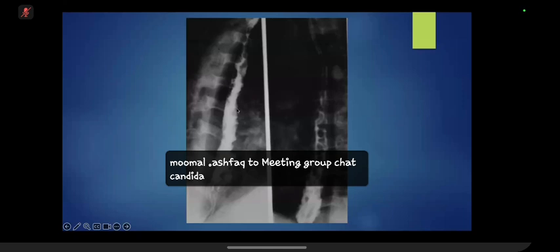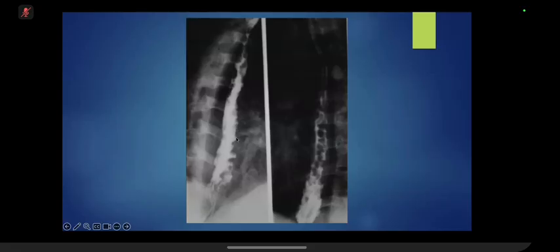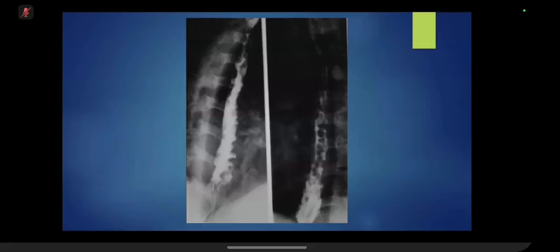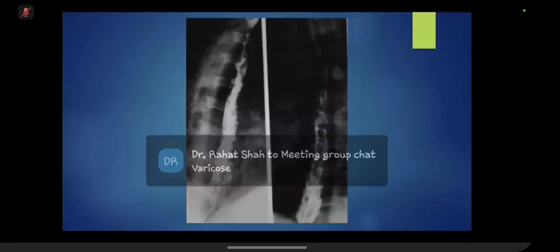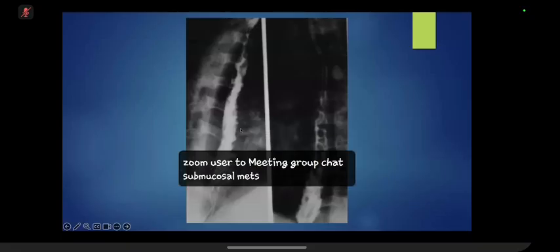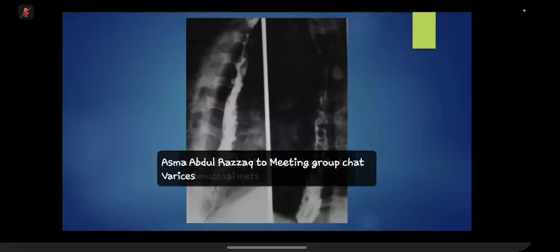So what do you think about these irregular indentations? Okay, so this can be intramural pseudodiverticulosis. I don't see any tiny diverticula, but okay. Anything else? Because of mucosal irregularity all throughout the course of the esophageal lining, I'm thinking of some esophagitis, maybe viral or candida.